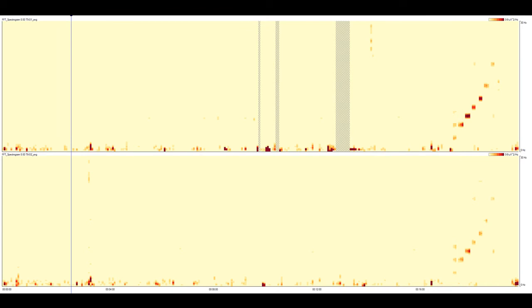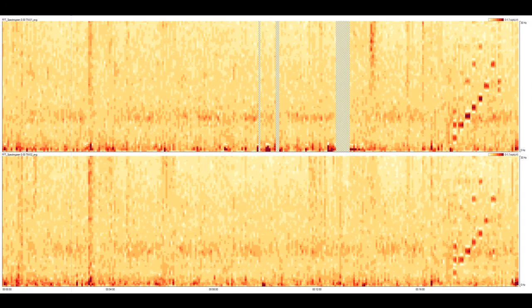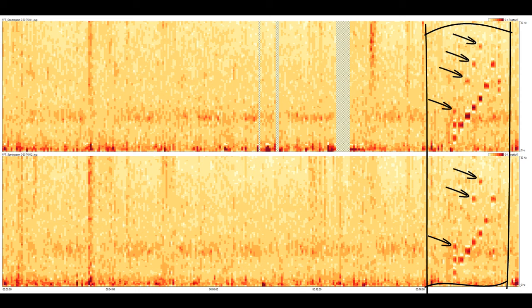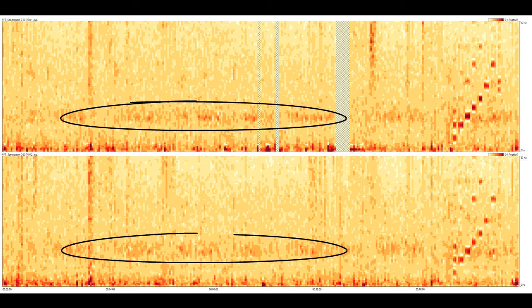So, although it can be used, the microvolt squared option for scaling the z-axis doesn't seem to be the best choice. Another option, though, going in the opposite direction, often provides a better dynamic range for depicting the EEG's activity. This is a square root scale, which is obtained simply by taking the square root of the linear z-axis values. As shown here, this allows better painting of the full range of EEG activity. Not only are the photic driving responses well visualized, but the harmonics are a bit better evident, and the patient's resting alpha activity is also more obvious.